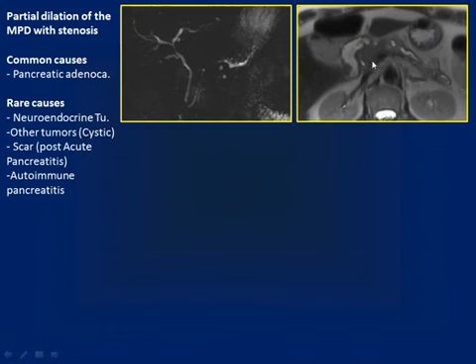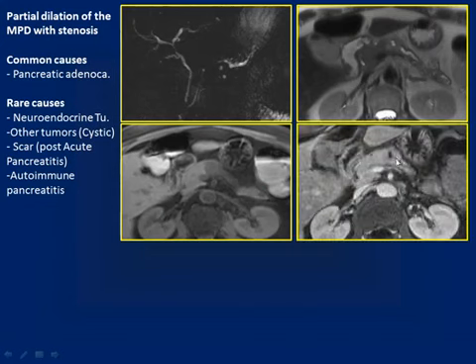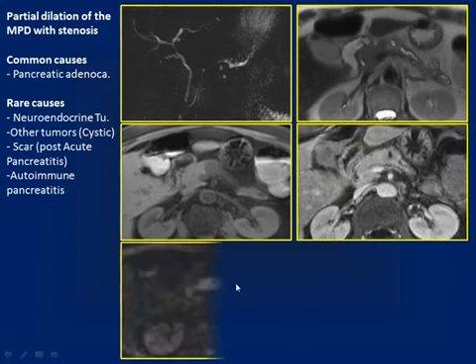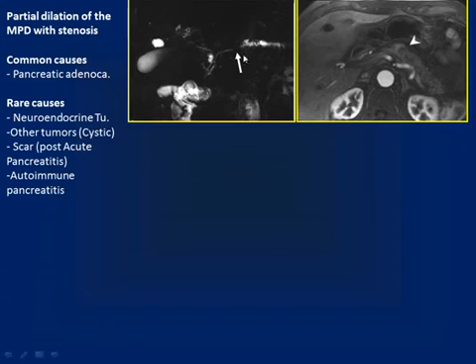The axial section will confirm the presence of a low signal intensity area in the T1 FAT-SAT image with non-homogeneous enhancement following contrast administration and restriction in diffusion-weighted images and ADC, or whether there are also other causes. But this is the most common cause, and all cases like this will be first a pancreatic adenocarcinoma and then other possibilities.